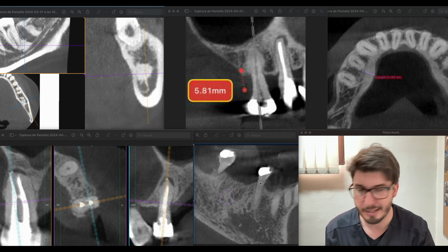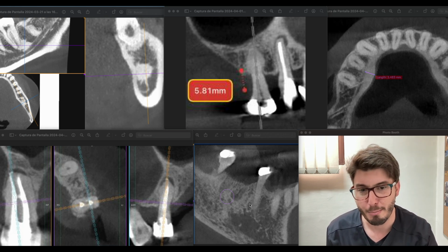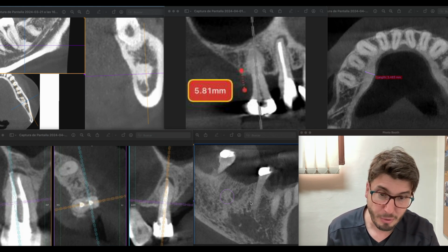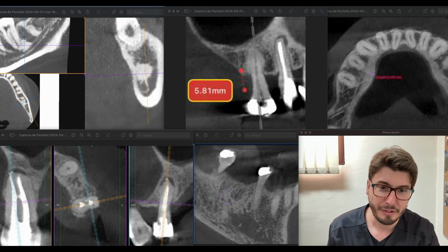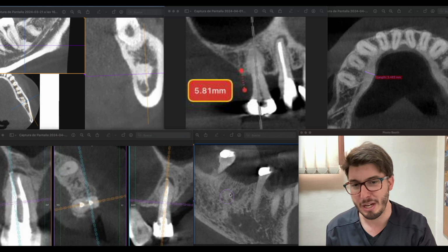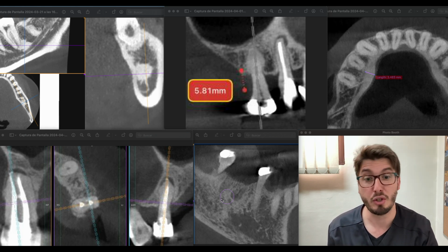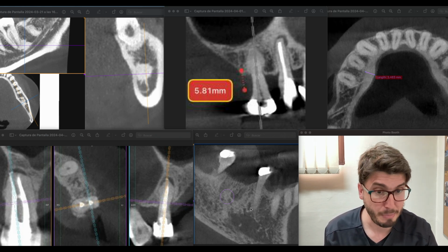So first the clinical examination, but then we are seeing that we have this part of the bone more radiopaque. It's not exactly well limited, maybe partially well limited, but then even after the extraction of this molar, we are seeing the more radiopaque bone areas in the periapical region of this tooth. So that's basically how the condensing osteitis happens.